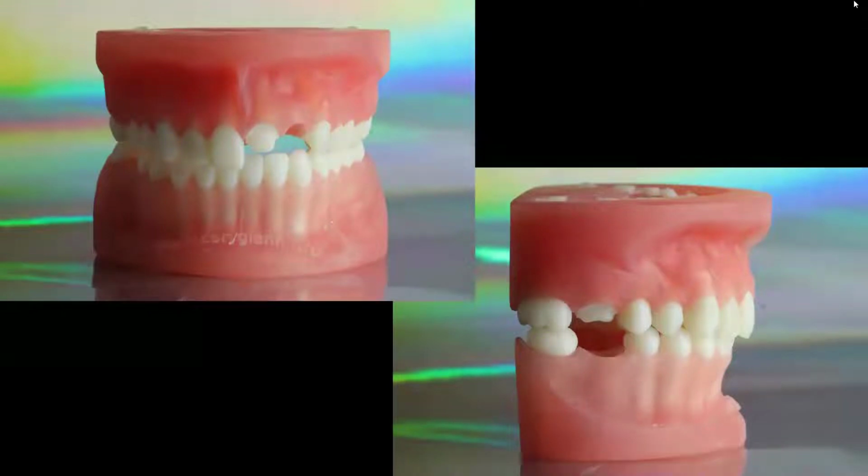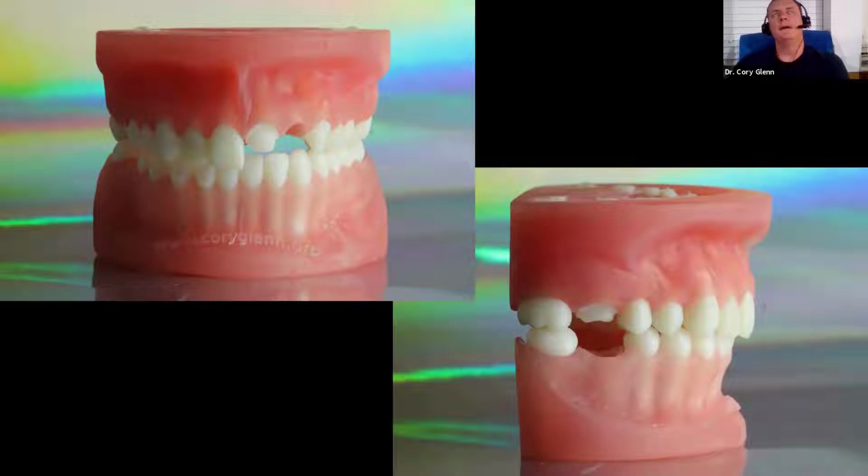Okay, the bottom line is he's asking about digital articulations. Okay, so I'm not sure if what's meant by that is the ability to pull in and stitch models to a different bite. So for example, let's say you wanted to do a wax up at an increased vertical, I'd actually do that in the intraoral scanner. I'd prop them open to the right VDO, capture a buccal bite, and then, yeah, absolutely, you can stitch the models to that new opened vertical within Blue Sky.